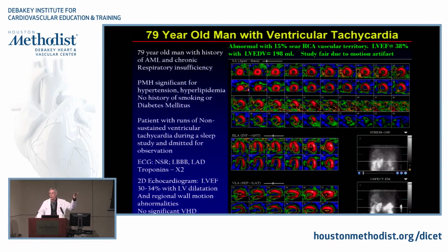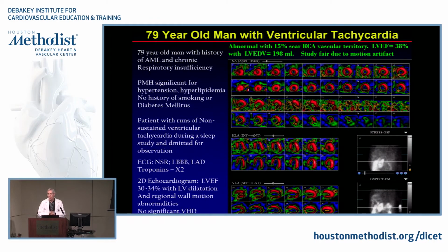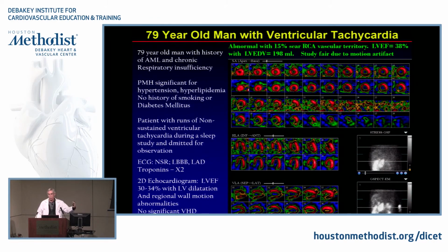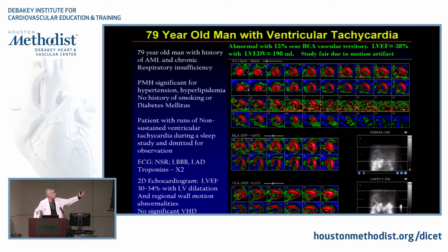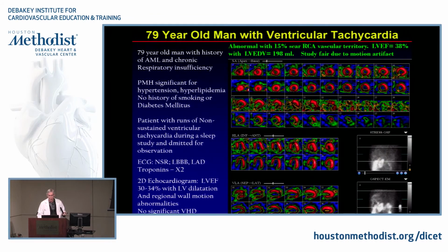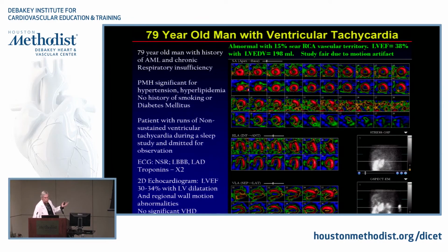So now we're thinking the patient could potentially have something in that right coronary artery distribution, in terms of either hibernating myocardium in that area due to ischemia or after being stressed, or having an infarct potentially, okay?